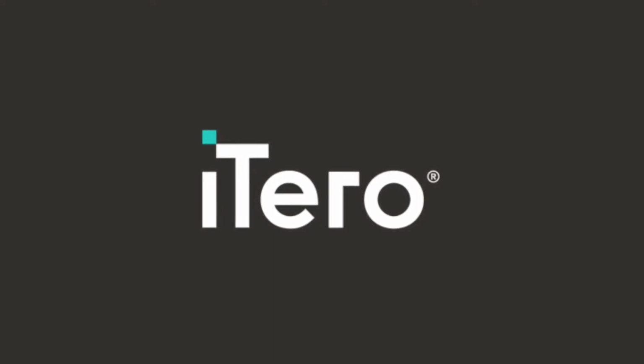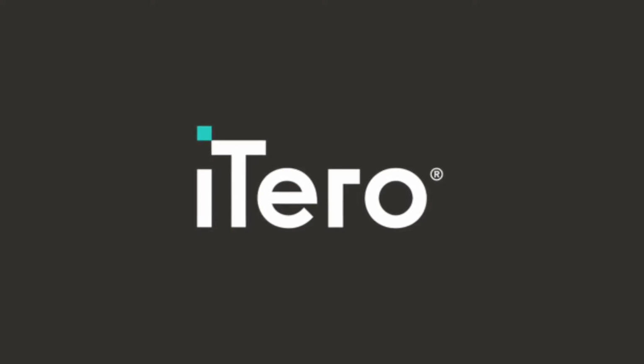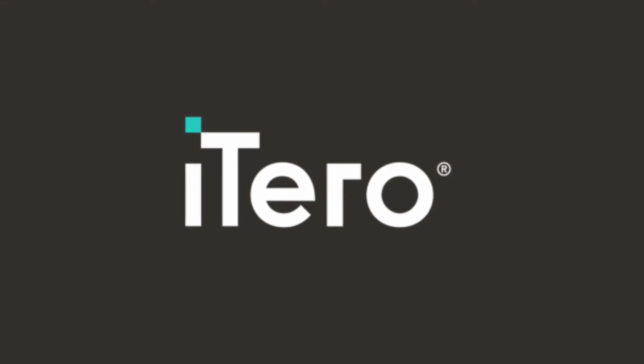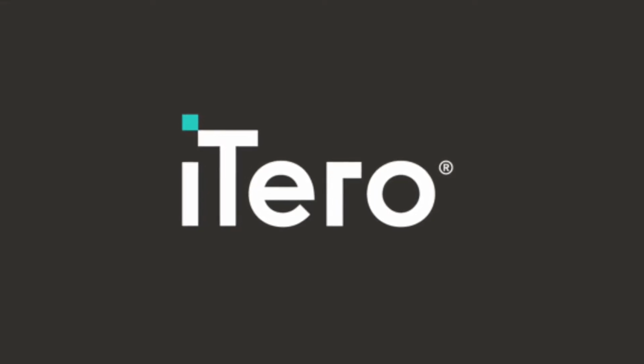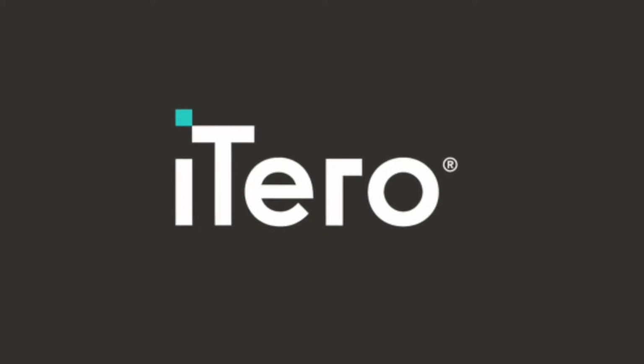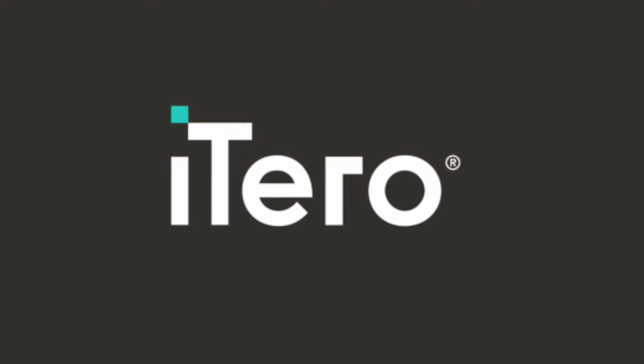The objective of this video is to assist you in leveraging the tools found within your iTero digital scanning platform to give your patients the most comprehensive digital dental solutions available. In 2016, just 22% of dental treatment plans presented to patients converted to actual treatment. Our goal is to assist you in maximizing utilization of your iTero digital scanner to increase case acceptance for both restorative and orthodontic applications alike. Let's get started.